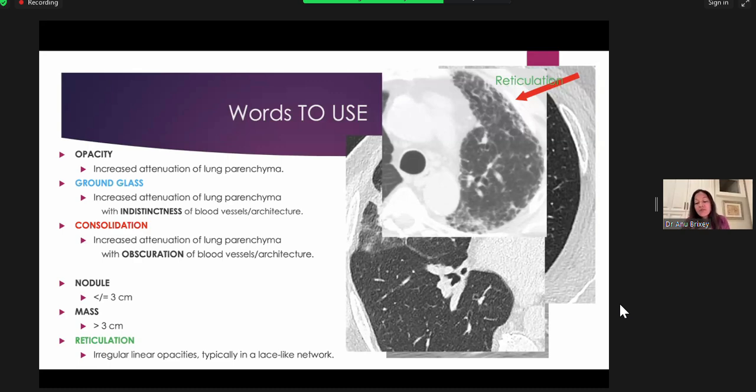And this is different from pulmonary edema, where you might have those hexagons from the secondary pulmonary lobule. These are just very irregular crisscrossing lines that often happen in the periphery, and they're seen most commonly with interstitial lung disease or pulmonary fibrosis.